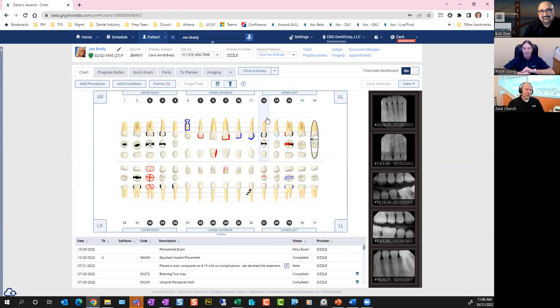And this is what you were referring to before, with the ability to see. And actually, this is an additional capability that we didn't really touch on. These colored circles represent teeth that have images. And it's not just teeth that have images, it's the relative age of those images. The ones that are this darkest color are the images that are 0 to 6 months old.